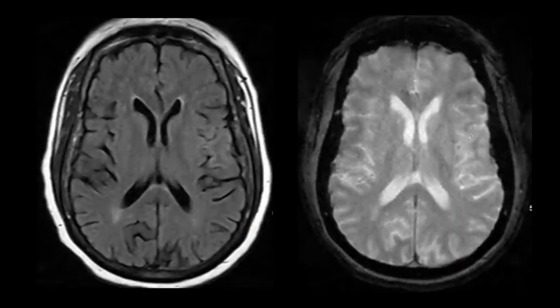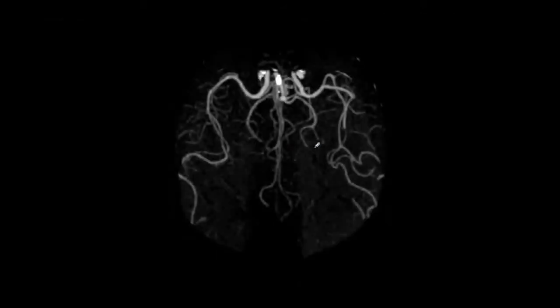And the next thing, as a neurologist, what do you want to know? Then you'll ask me this particular question and I would answer it, and that's based on the gradient sequence. Is there blood or not? So does this patient have blood? No. So it's a non-hemorrhagic acute infarct.